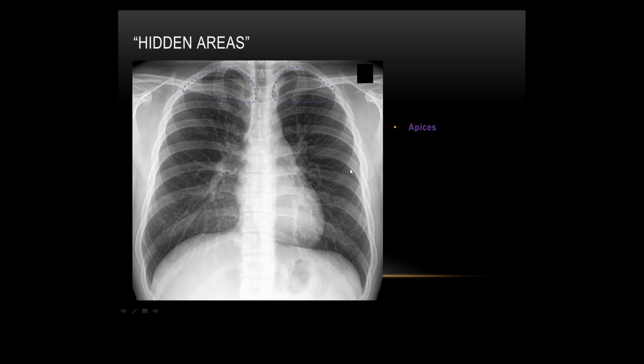We had a case recently where a chest X-ray was reported as normal, which I think if you were to look at it in hindsight, you'd probably say it even still is a miss because it was that subtle. They had a follow-up chest X-ray about 6-7 months later, and you could just see the outline of this nodule creeping past the clavicle border. So it can be quite tricky, that area. Again, particularly for patients who are kyphotic. So it's one of the hidden areas.